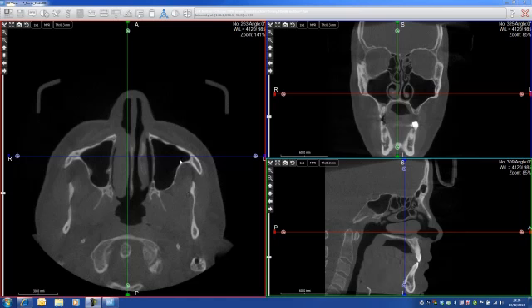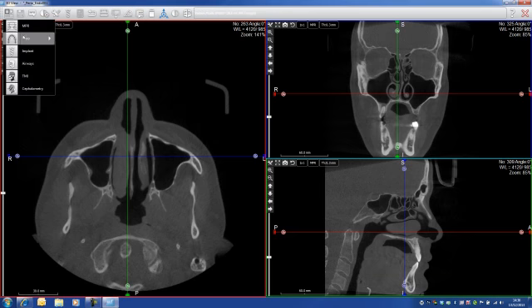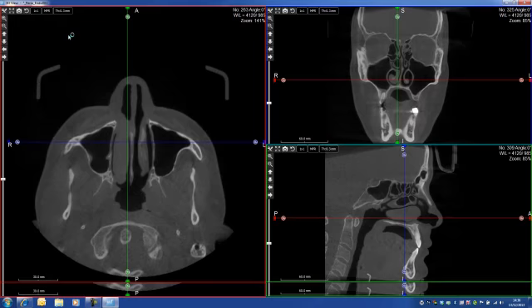Okay, so as a radiologist, what you need the most is to be able to make a panoramic and generate cross-section. Once the cross-section has been generated, what you want to do is make your report. So let's start from the beginning. I go here, select panel, dental panel.